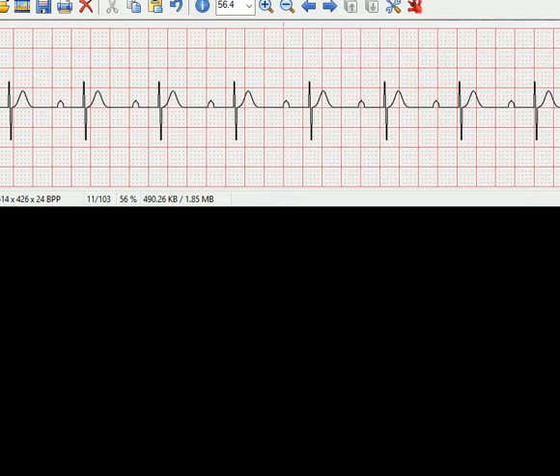Alright, if you look, the QRSs here are narrow. I have P waves. They're upright, round, and symmetric. PR ratio, is it 1 to 1? Well, I'm missing a P wave here, so I got more QRSs than P waves, but it's clipped off at the beginning.